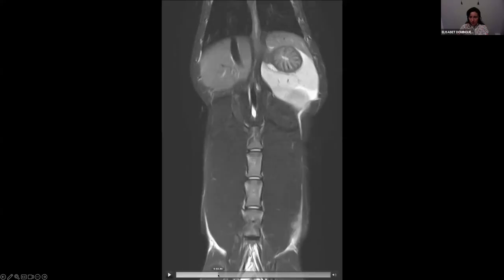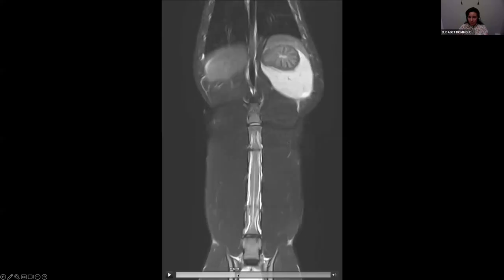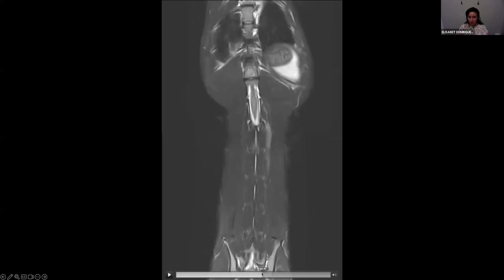So here, more or less in the middle, we see that the vertebrae have a normal length, and the intervertebral discs have a uniform width, and they are hydrated. They have a normal signal intensity on T2. But as we move a little bit more cranial, here is more or less at the level of T13 because we see a rib and this is L1. We see that this intervertebral disc space is narrow, and the nucleus pulposus is a little bit smaller than normal.